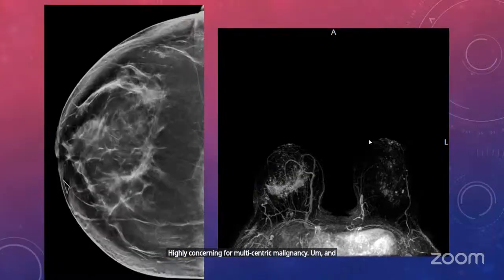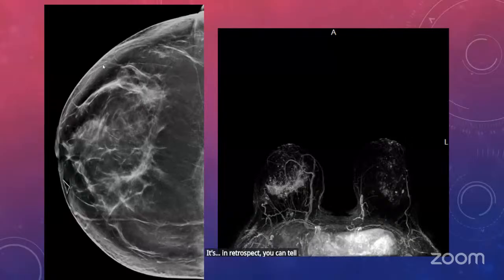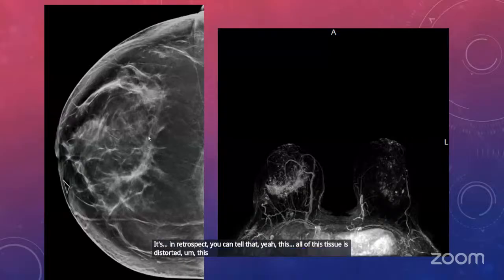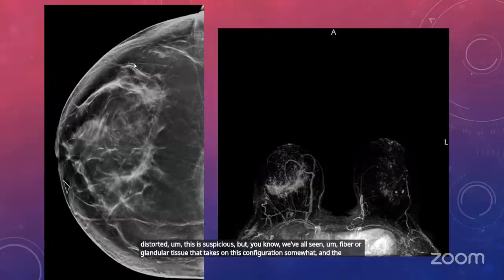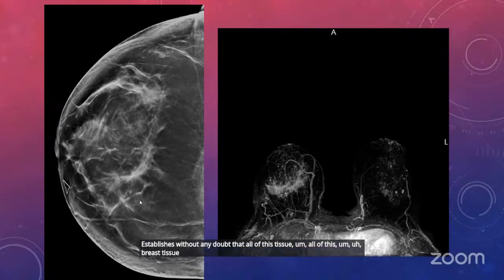So you go back to her mammogram. In retrospect, when we were initially looking at her mammogram, you can tell that all of this tissue is distorted. This is suspicious, but we've all seen fibroglandular tissue that takes on this configuration somewhat, and the MRI really establishes without any doubt that all of this breast tissue is invasive lobular carcinoma, rather than just this area we were looking at or just that area we found on the ultrasound.